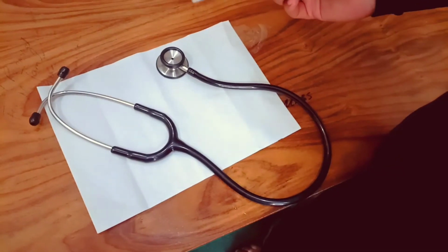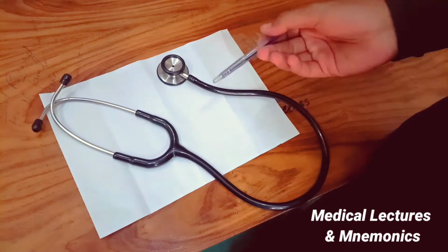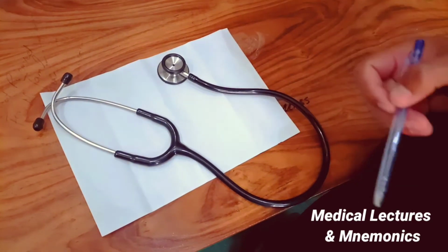Welcome dear student. Today I am going to talk about the stethoscope, its definition, parts of stethoscope and the function of stethoscope. So the stethoscope is a medical device that is used for auscultation.